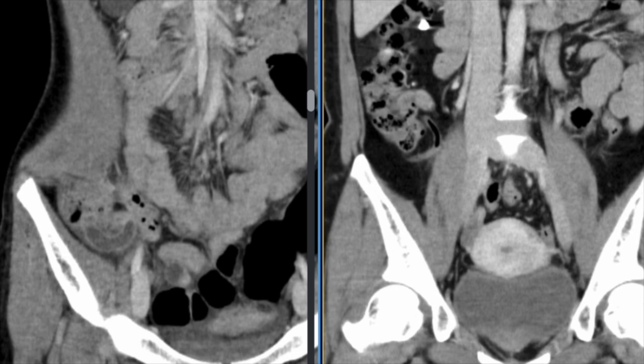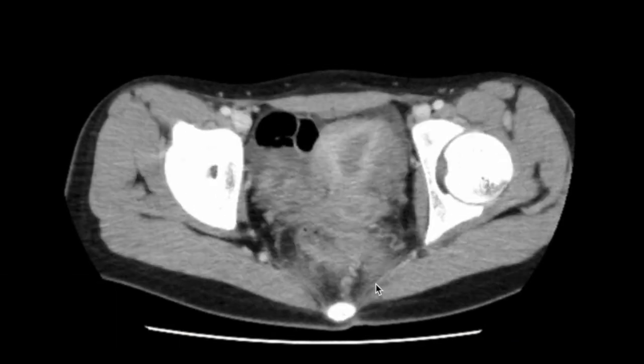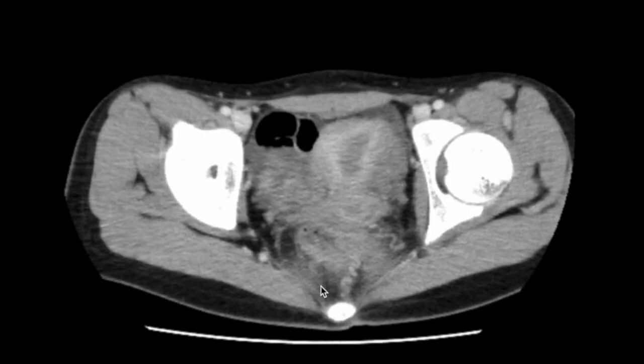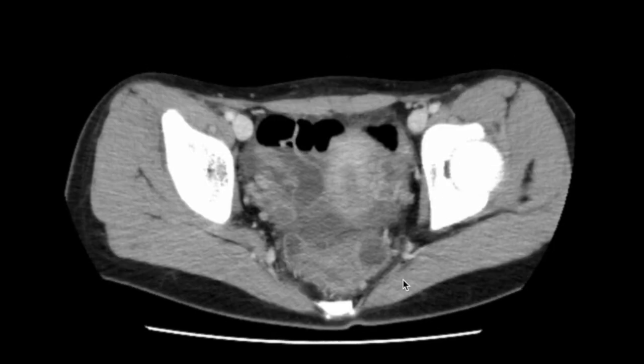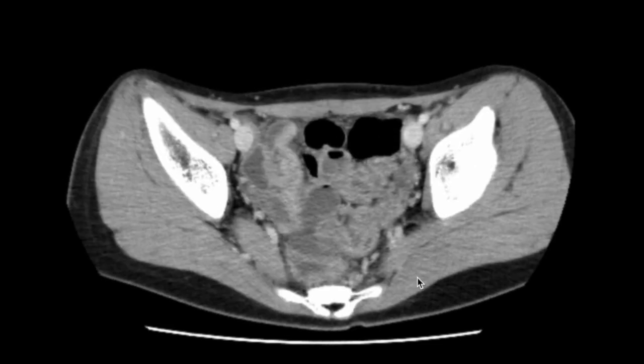Now let's level up a bit. Identifying appendicitis is excellent, but let's search for additional secondary findings. Is there ascites? Down in the pelvic cul-de-sac, this area looks like ascites. It's only a small amount, so the clinical significance may be limited, but some free fluid is possible. Ascites can indicate peritoneal irritation or even peritonitis, so the presence of fluid often correlates with more severe disease.